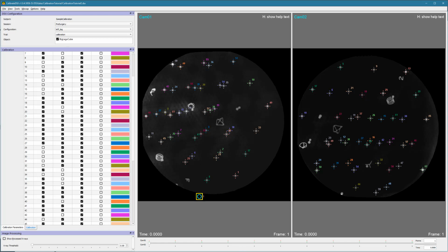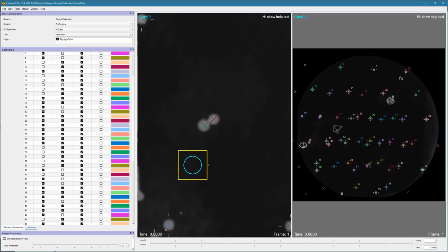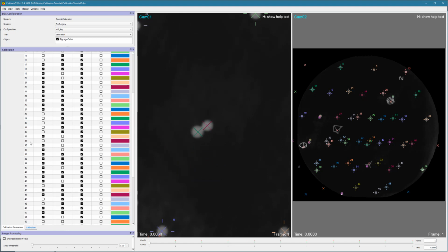Let's start by turning on the display of what's called the Perfect Calibration Beads. This command is similar to Predict POI Locations, but it displays X's at the projected locations instead of calculating their weighted centers. It shows you where the beads would be if the residuals were exactly 0. Now let's go back to beads 34 and 53, which we removed earlier, and manually digitize them. We can see the bead 34 has a purple label, so it's the one in the image with the purple X. Now let's turn off the X's and select bead 34 in the table.